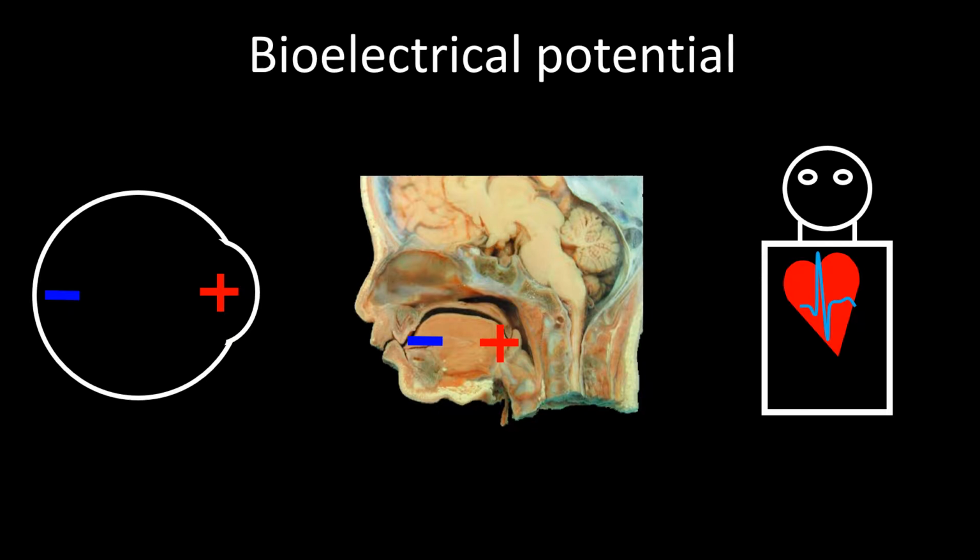The third common bioelectrical artifact arises from the heart. The vector of the heart electrical energy is down towards the left leg, and it is negative at the right shoulder and neck, and it is positive towards the left thigh.